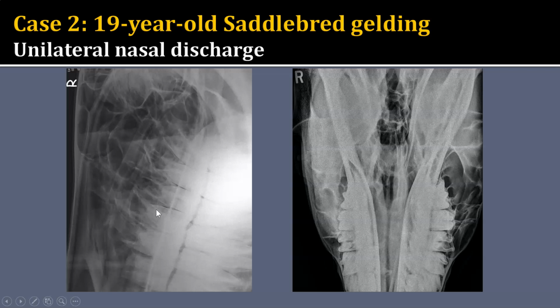This would be the rostral compartment that has increased fluid opacity, and then this would be the caudal compartment that actually has the fluid line. There's an additional fluid line here in the region of the conchofrontal sinus. So just the frontal sinus is here, and then there's also that dorsal conchal portion that kind of is communicating. So there are fluid lines in two of the sinuses.